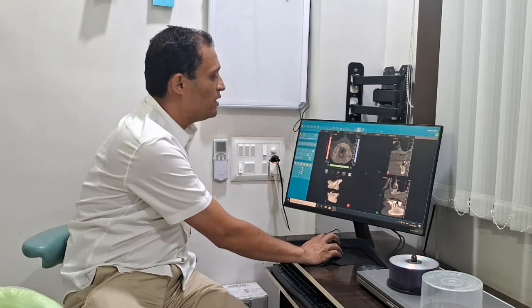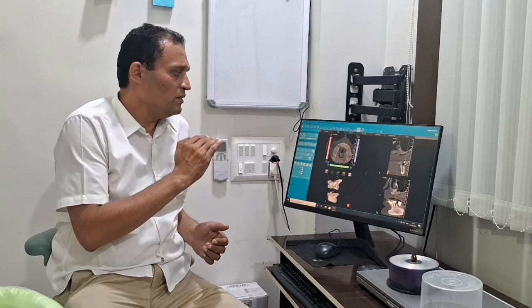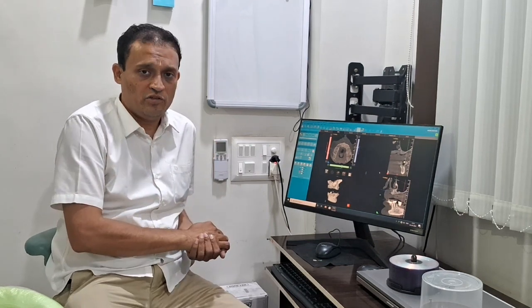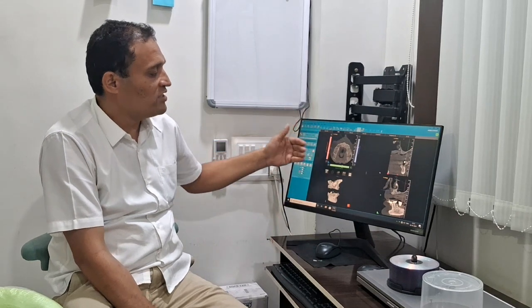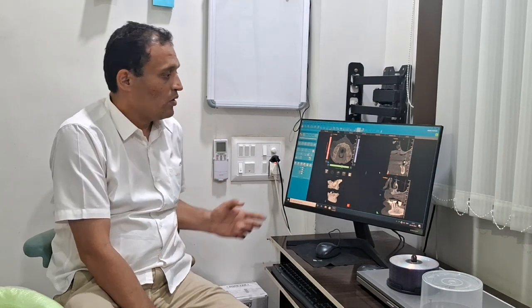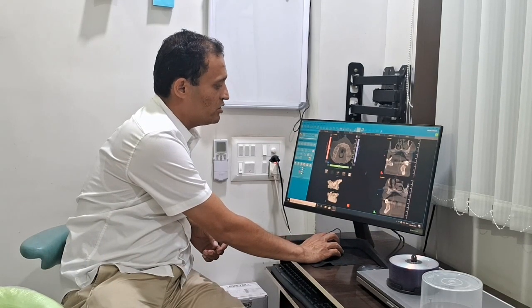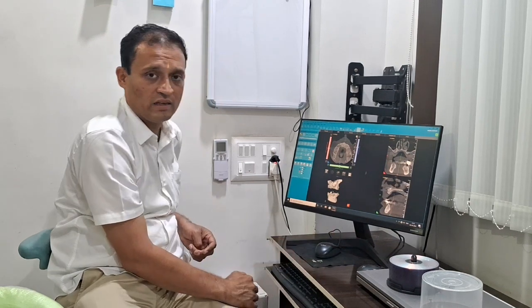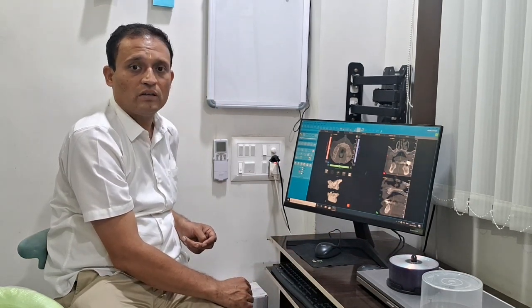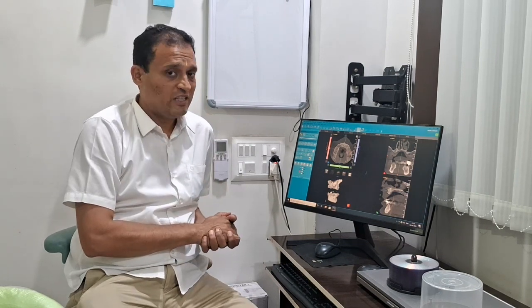Then comes the multi-planar reformatting. This is known as multi-planar reformatting. Multi-planar reformatting means in any plane we can reformat the image. We can format in axial section, coronal section, sagittal sections, or slices in any other plane. This is very important. By adjusting the axis or the plane, we can adjust the sections very easily. Now we'll see the basic software details for this patient.